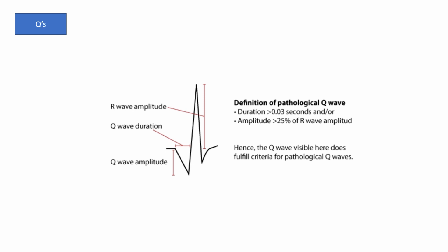All right. Then we talked about the significance of what is a significant Q wave. Here's one definition for that. Again, you'll see different definitions depending on the pages and the guidelines, but they're roughly within the same ballpark. This is not an exact science. This is likelihood ratios, right? If we look at the patterns, is it one Q wave in isolation without anything else? Then maybe not. But if it's several in neighbor leads with a good history, then even though they don't live up to these criteria, we'll still be very suspicious.